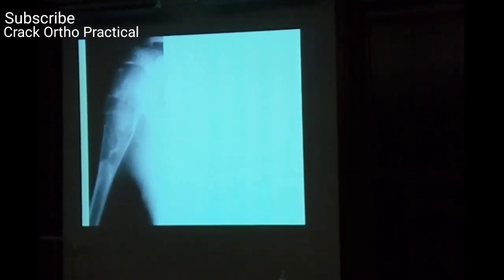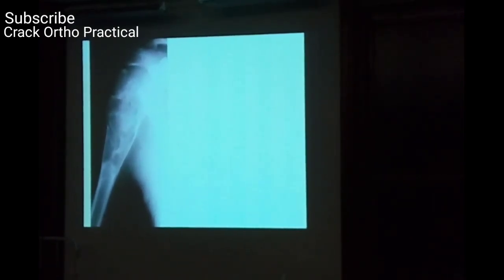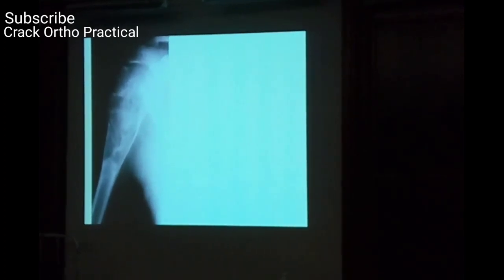This is an X-ray of the proximal humerus with the shoulder joint of a skeletally immature individual. Which view? Difficult to tell. AP view of adequate exposure. MBBS used to tell that it is adequately exposed, well centralized, plain skiagraph, but I don't need it in ortho.